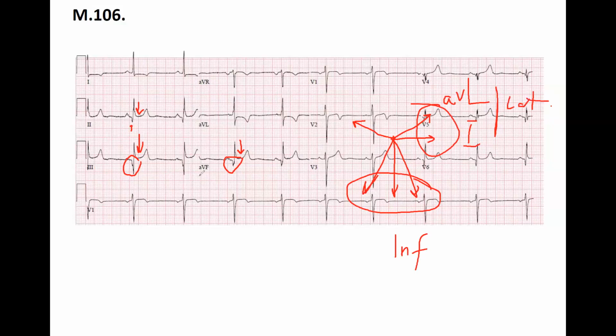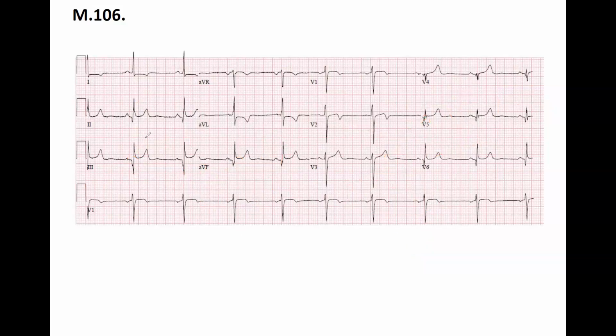Now, in the chest leads, if you do see changes in V1, V2, V3, V4, that's a septal, anterior. And this is going to the lateral: V5, V6, and together with 1 and AVL, this is a lateral. That's the position. It takes a little time, but you will become very familiar with these positions. Okay, so now we do have an inferior one.